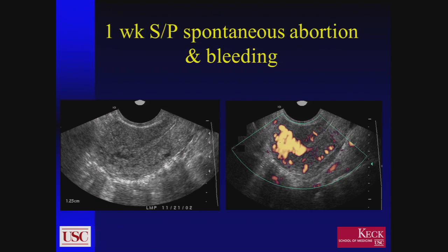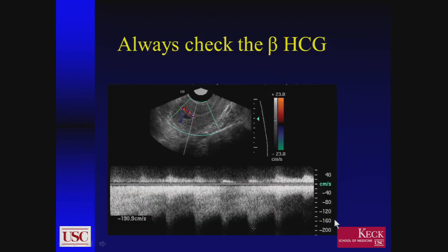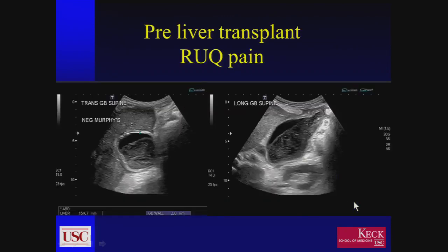So do keep the two in mind, that the history is very, very important. History number one, if it is an AVF, is it congenital versus acquired? Then number two, in the back of your mind, when you see this intense area of color Doppler or vascularity extending out of the endometrium, if the patient has a proper history, this could have a very similar appearance on ultrasound to retained products of conception. And even that can have this very, very low resistance vascular flow, and the two can be almost identical sonographically, but a very different situation.